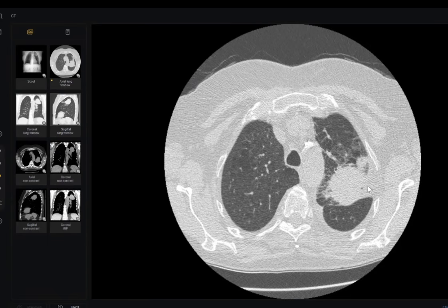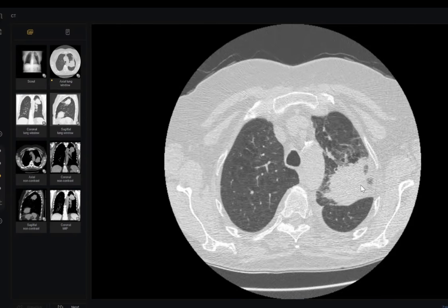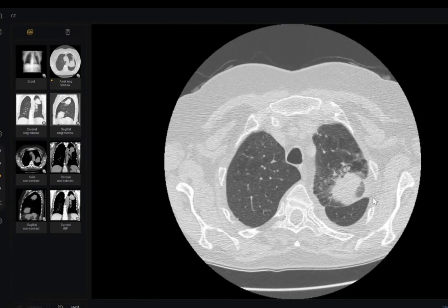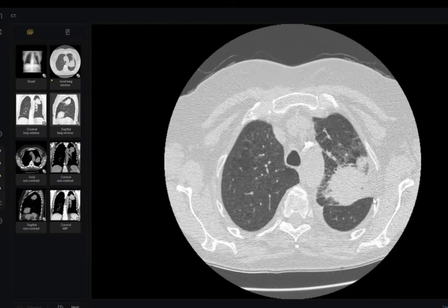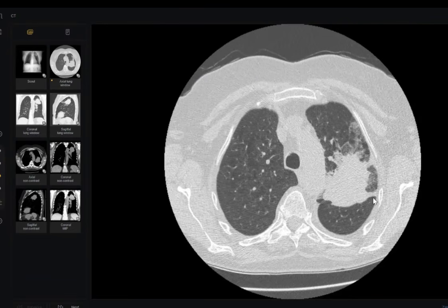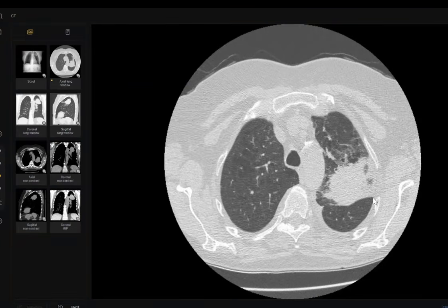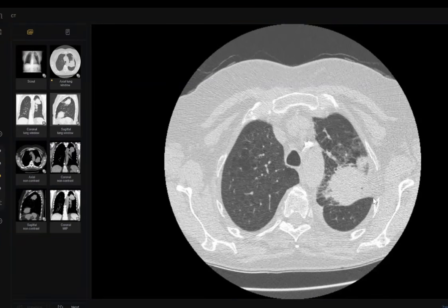This location is lateral. I didn't mean to go through the scapula or the muscle, but from here we can go up, and we can go from lateral. But here, too little bit lateral is difficult because of the scapula. Anyway, we choose in the lung the part which is abutting or infiltrates the pleura.